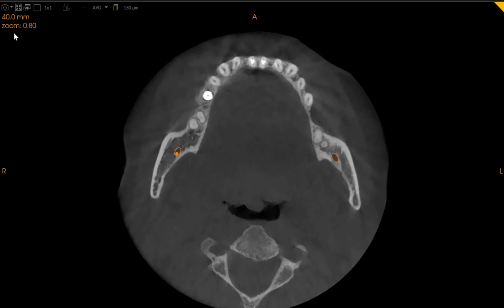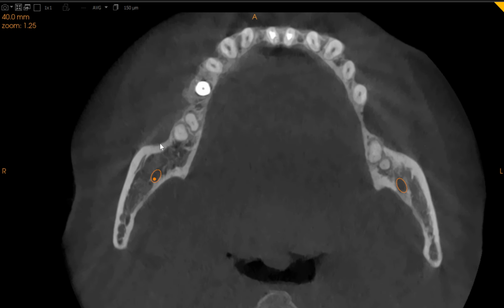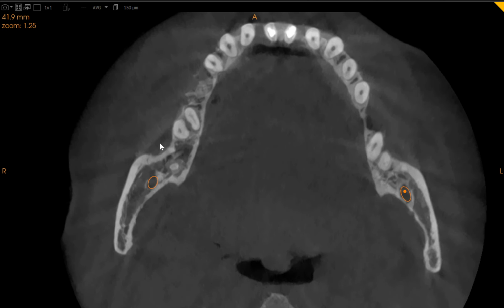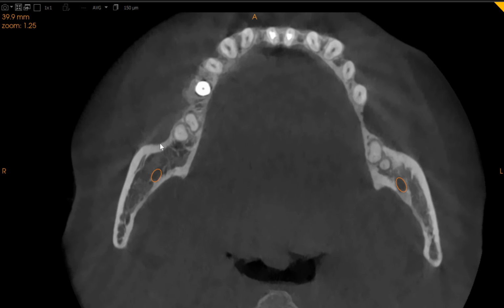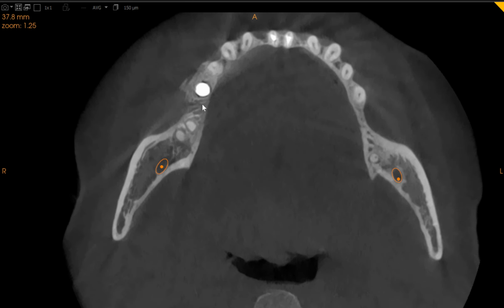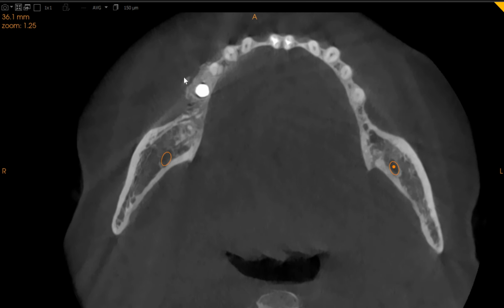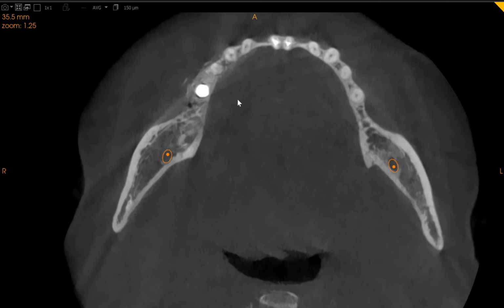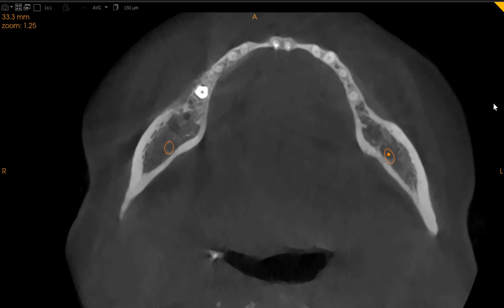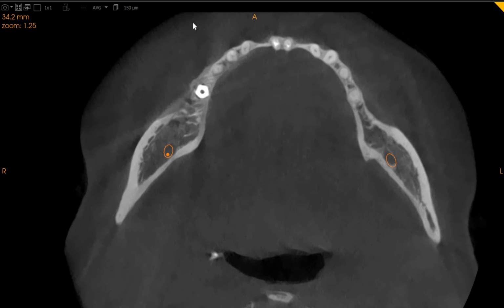This is the axial view. As you can see very clearly, this is the crest of the ridge. As you can see, it's all grafted. Then comes the implant, very well grafted, and you can see bone on the buccal aspect here. And throughout this axial view, you can appreciate this excellent bone covering all the aspects of the implant very well, with no periapical bone loss observed.